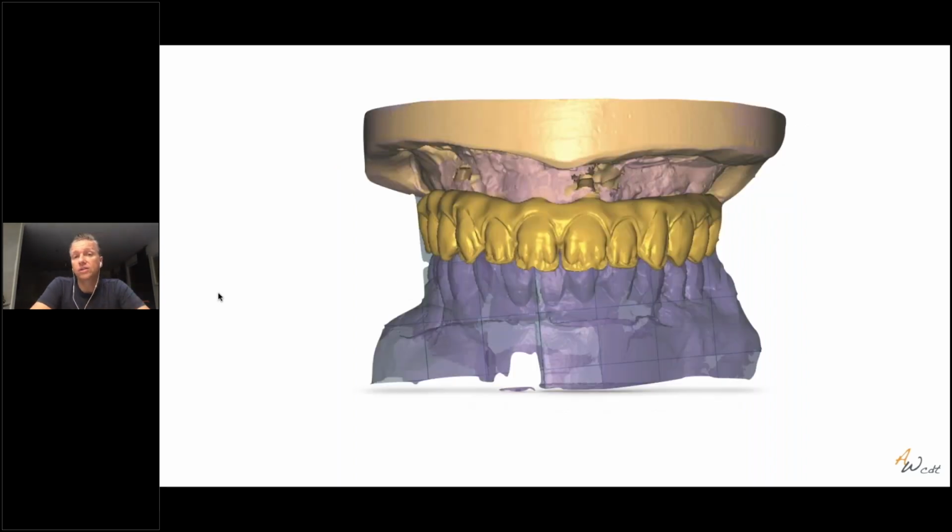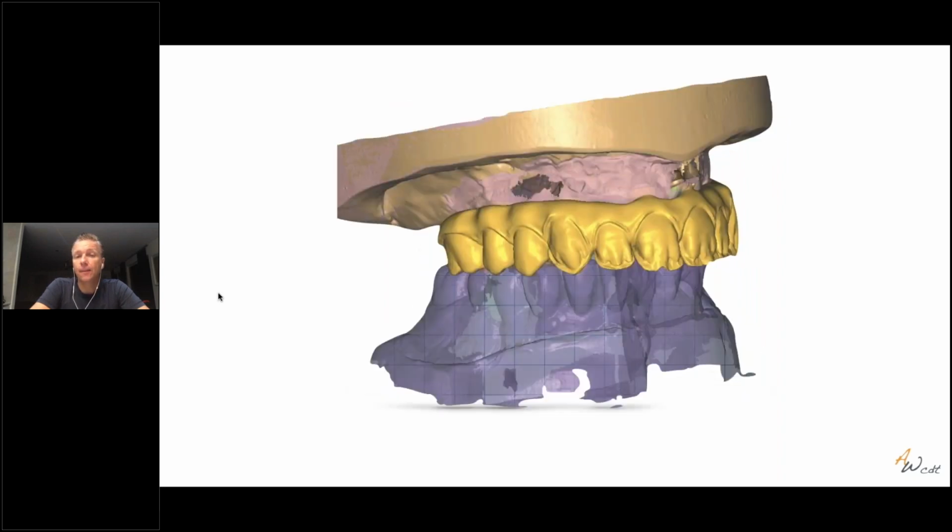Here I can also then cut back the aesthetic zones. I can cut back the anteriors. Usually I cut back from first premolar to first premolar or more. That depends on our customer, our patient, where we want to put the translucency in more. After designing or basically creating these cutbacks, very minimal cutbacks, I usually don't cut back more than 0.5 millimeter for a micro layering. I then can mill the restoration in zirconia.